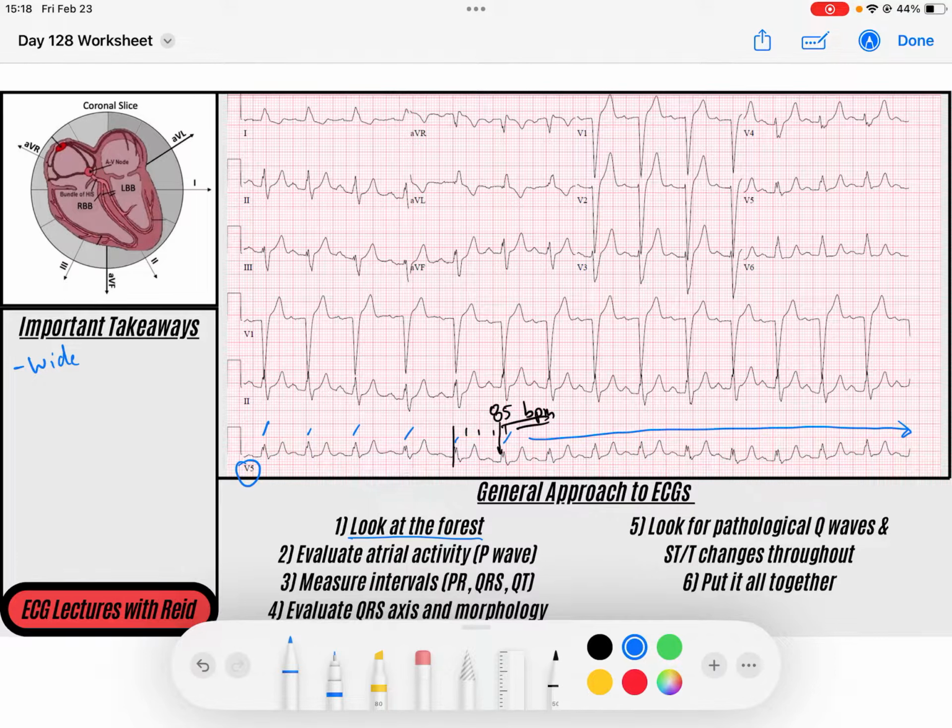Okay, so this could be either a ventricular rhythm, this could be a normal type of sinus rhythm with an aberrancy, right? So kind of working through that. And I look through, just generally speaking, I see I've got nice P's in front of my QRSs, right? You can look up here. Here's my P waves, right? And here's my T waves, right? Starting to kind of work through. So maybe this is coming from above. Maybe this is an aberrant conduction, right? Let's start to work through it.